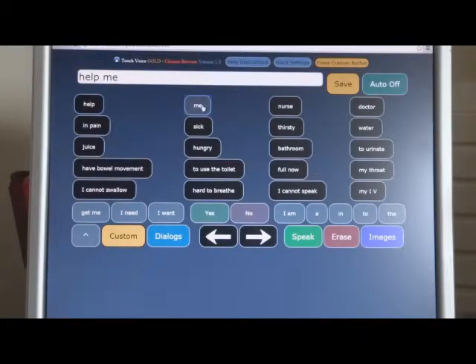Help. Me. Nurse. I want. Water. It speaks and then displays what is spoken on the speech line up here at the top. You can erase the speech line by pressing the erase button. I need. A. Doctor. You can re-speak the speech line by pressing the speak button. I need a doctor.